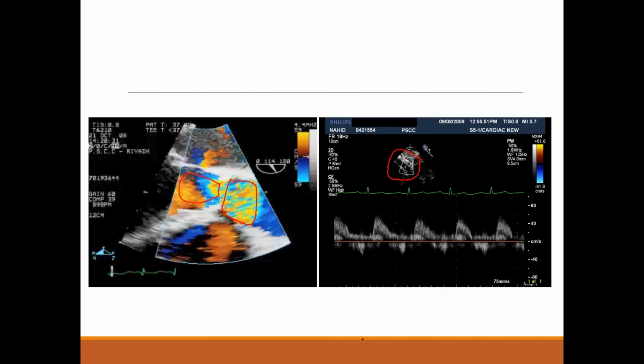Now, this is the abdominal aorta, and this is the flow of the abdominal aorta by PW. So what do you see? Diastolic reversal. Yes, that's the reversal here. But this reversal is not yet pan-diastolic, because if it were pan-diastolic it would look like this, starting from here and occupying all of this. If it's pan-diastolic in the abdominal aorta, this is almost definitely severe.